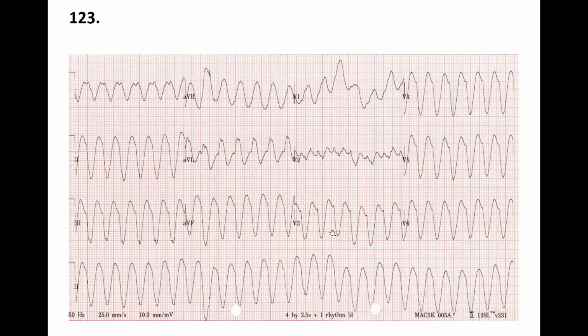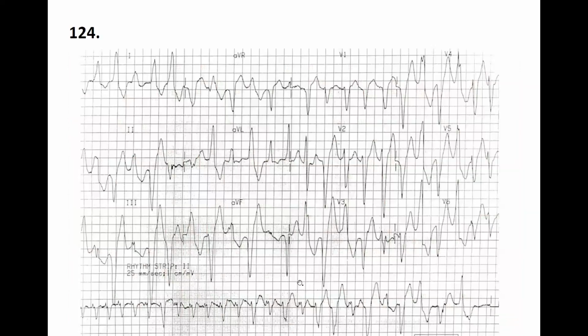123. That's a ventricular tachycardia. Which is the last one? Non-sustained. Yeah, that's a non-sustained. But what else? Who has another number? Because I think it's almost the finished view. Who has some ECG tracing? Who left out? I can check it. Let's see, I want to check what the last one is.